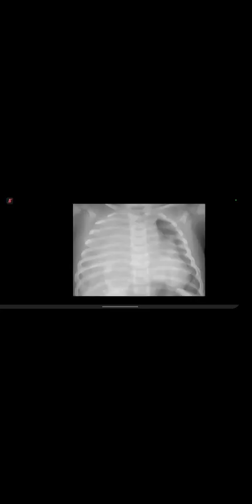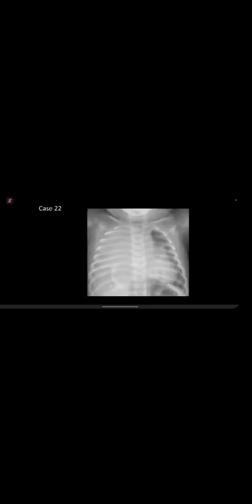Okay, that was good. But did you say this was calcification? I think it looks more like a dense curvilinear structure. Okay, but do you think it could be a vessel when there's a whole white out? And what do you think about the mass effect, because there is a mediastinal shift to the left?